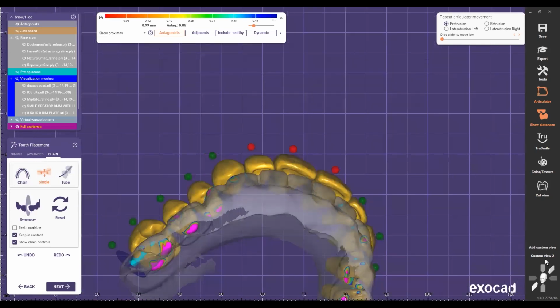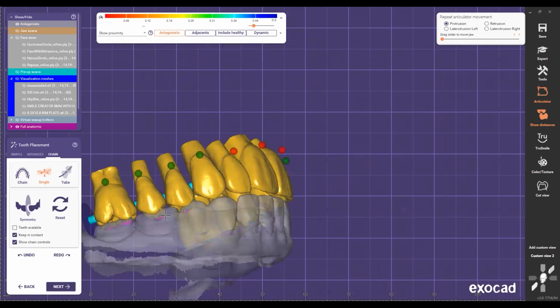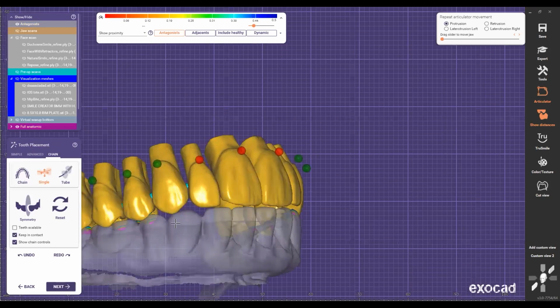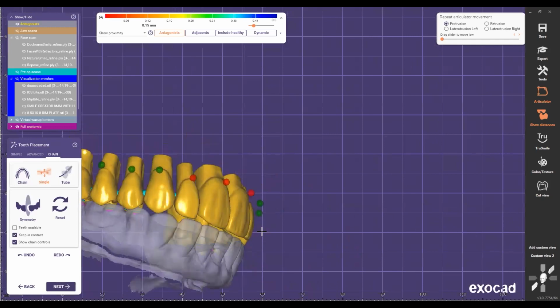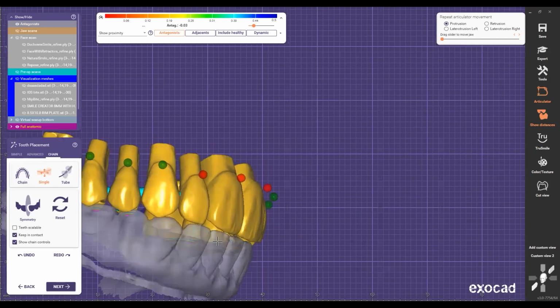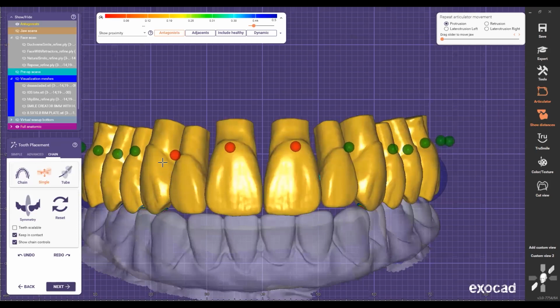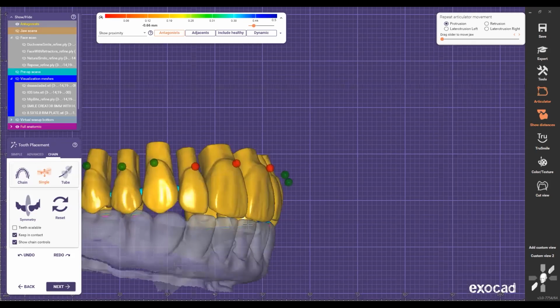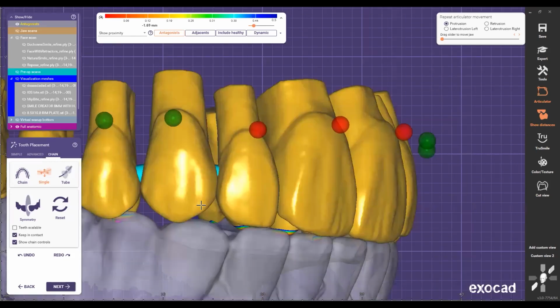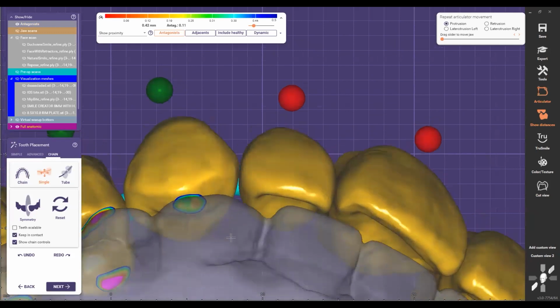So now I put it from the front and I wanna make sure that I kind of hide the distal of that tooth a little bit, if possible. Here, I'm going to keep this one a little bit even or above, because I would like to bring this 0.3 higher than the lateral, but in this case, I want to keep it in occlusion and I don't want to make it bulky because I can see that surface from the front.